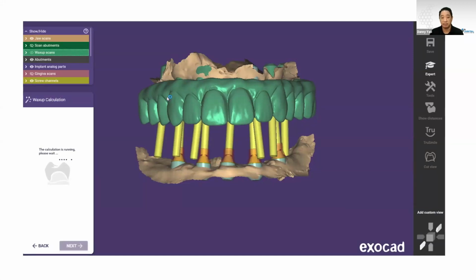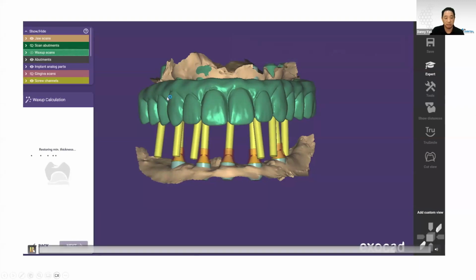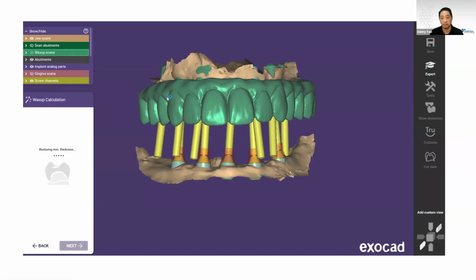You just snap them in, at least on the prosthesis. And so we've done that to ensure that this is as easy as possible, and there are some things that are unique about our process that make it a lot better and more accurate, frankly, than even some of the fully digital workflows that are out there.